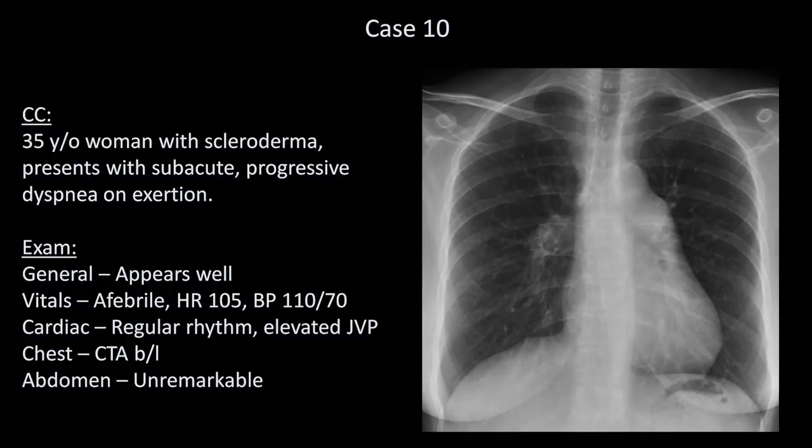B is for bone. The overall shape of the thorax seems subjectively a little boxy in my opinion. In other words, the lungs are not as tapered at their apices as seems normal, but this doesn't actually mean anything and is probably a normal variant. The clavicles and ribs are unremarkable, but the patient seems to have that tiniest bit of lateral curvature to the spine known as scoliosis. C is for cardiac and mediastinal silhouette, including the hilum.